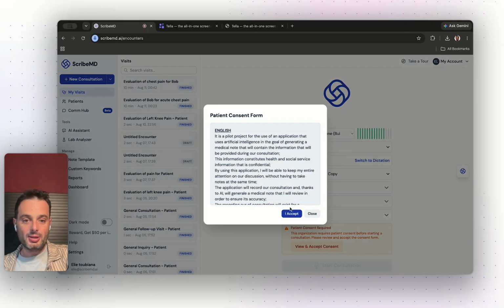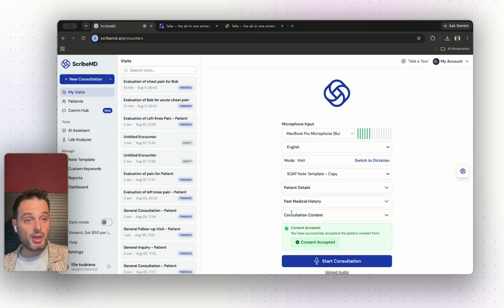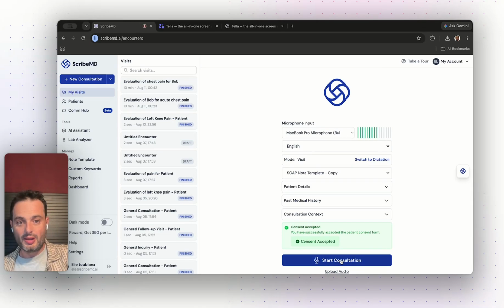But anyway, let's say now you're telling your patient, is that okay? I'm going to be recording you so that I don't have to take notes while we're talking. And if the patient consents, you can start the consultation here. So I'm going to press start consultation.